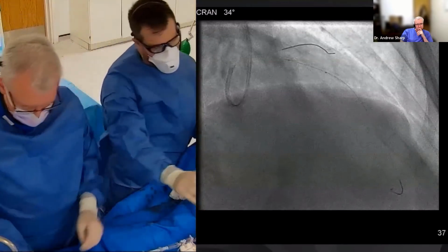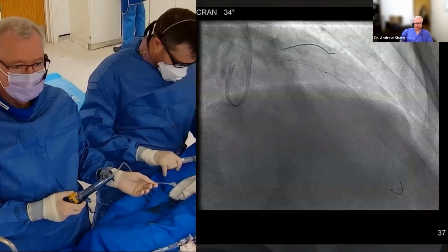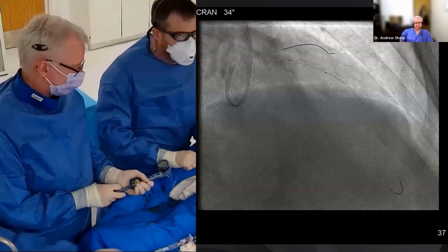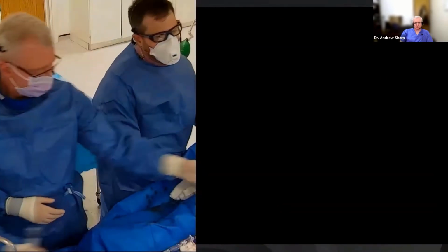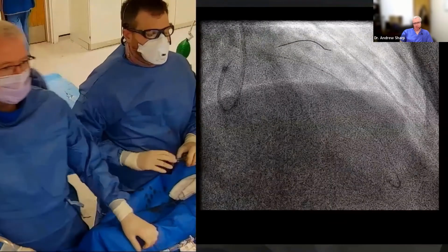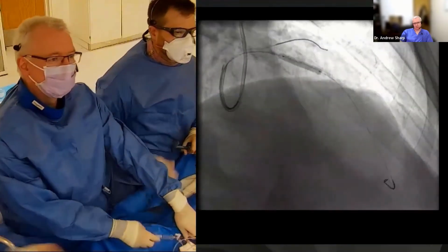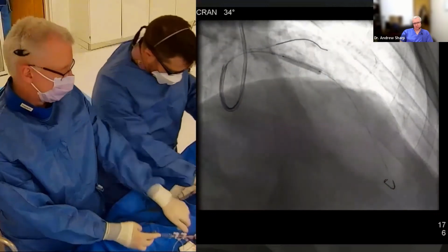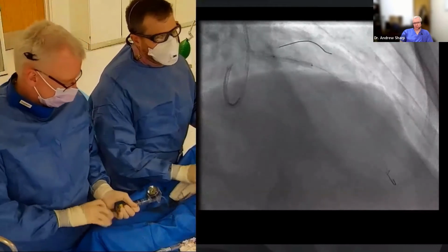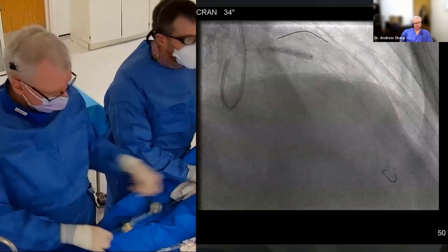I think that's really what we're doing though, Andrew, aren't we? We're segmenting distal to the diagonal into 2. Yeah. But then we're treating the vessel proximal to the diagonal separately. Yeah. Good. That's fine. Yeah, great. Up you go. It's 14. Yeah. And down. I'm just going to go a bit harder there. 16 there. 16. Good. And down. Down from 16.